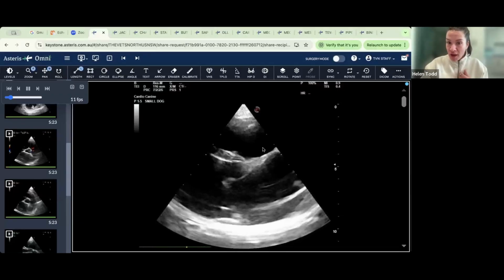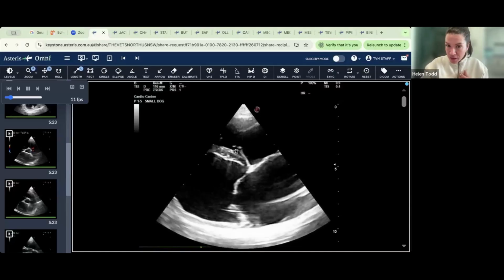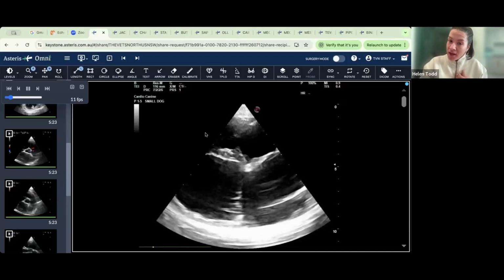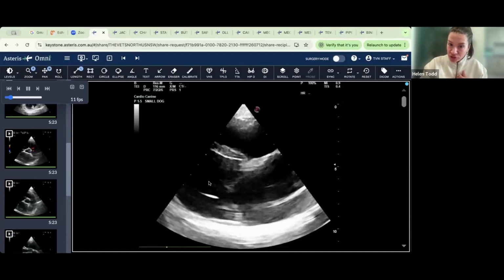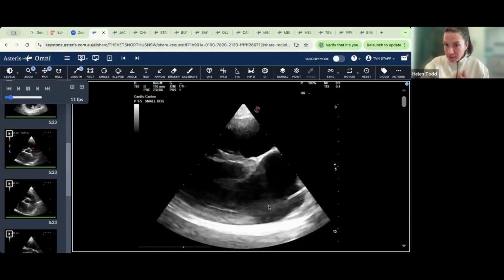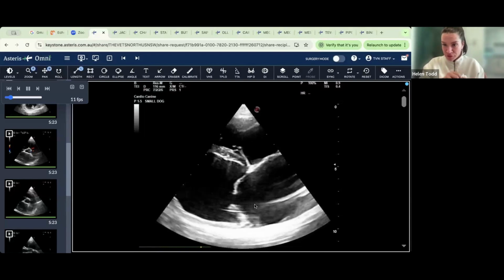Okay, so we've got right atria up here, tricuspid valve. You can just see here where my cursor is. Right ventricle. Our little right ventricle, he's only pumping blood to the lungs, so he's much smaller and thinner walled than the left ventricle, nice and appropriately. Then we've got left ventricle here, mitral valve coming across, left atria here. So that's our kind of bearings that we're going to focus on.